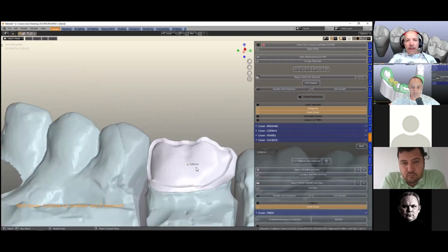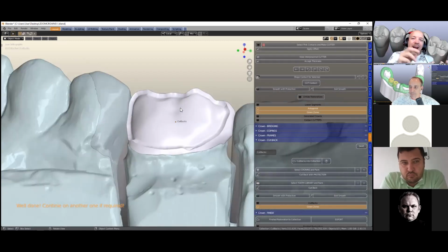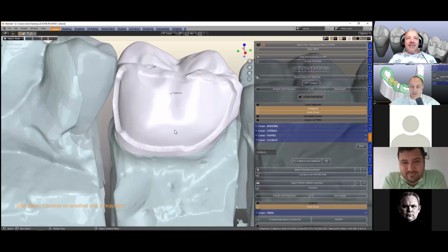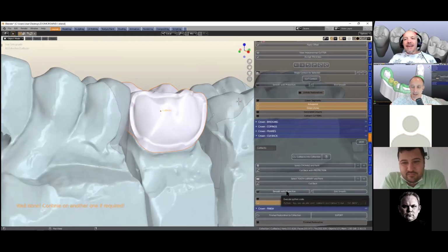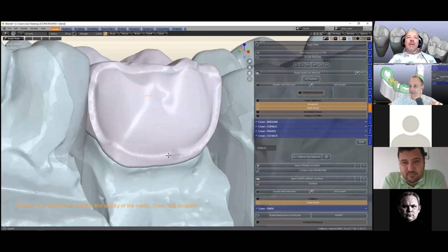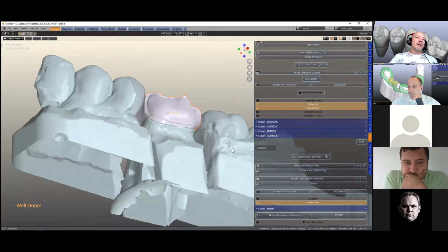Excellent. So we've got our window. In the olden days, we used to put salt and pepper with little plastic beads. So yeah, it's way easier to do telescope work and composite. It's called Verblendung. Okay, so we can smooth that as well if we want to, like that, and that's basically finished. Excellent, awesome. Yeah, so that's good.